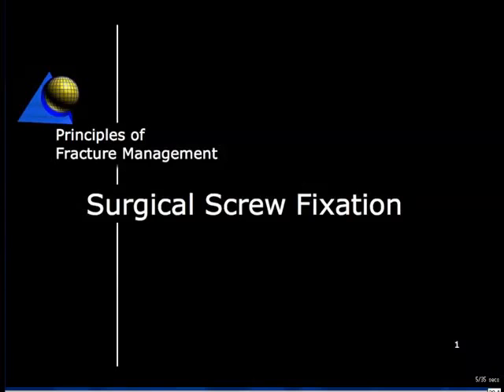...is firstly to describe the screw as a mechanical device, secondly to identify its physical attributes and its functions in surgery, and thirdly to outline the techniques for insertion in bone. After studying this guide, you should be able to identify the basic screw forms and sizes of the AO armamentarium and outline the principles underpinning the surgical techniques of using screws to achieve a variety of outcomes.